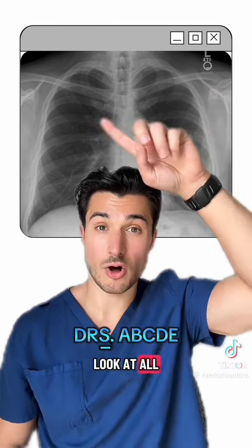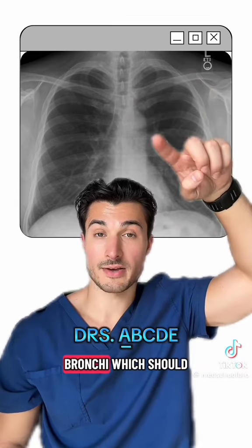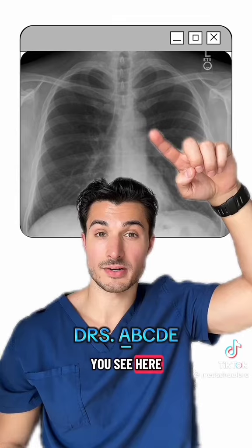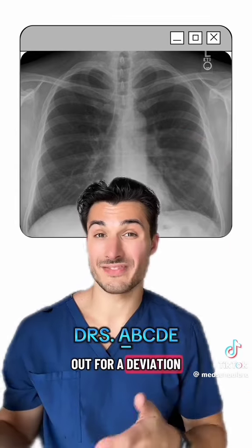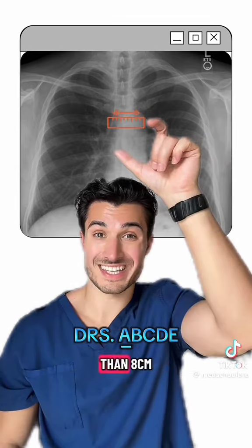Now A is for airway. We can start up here in the trachea and trace it down to the carina and then the bronchi, which should be midline as you see here. Think of your causes and look out for a deviation. Look at your mediastinal width, which should be less than 8 centimeters, and then also look to see if there's any hilar changes.